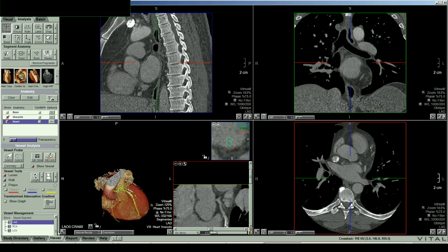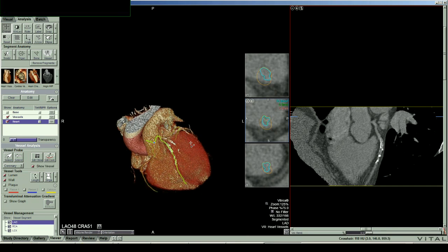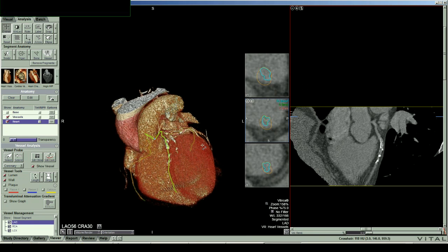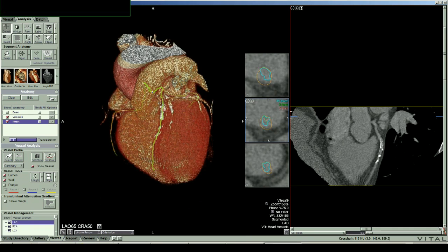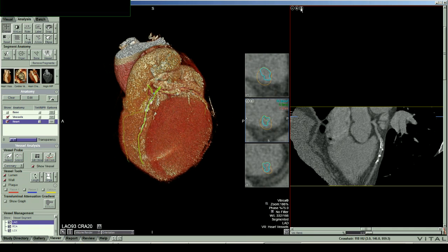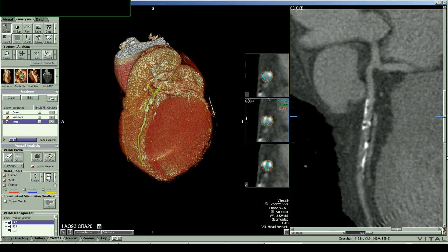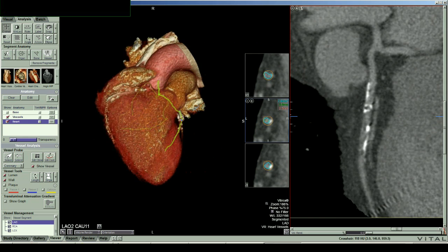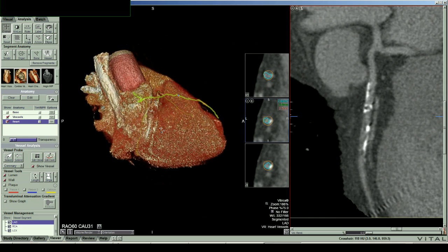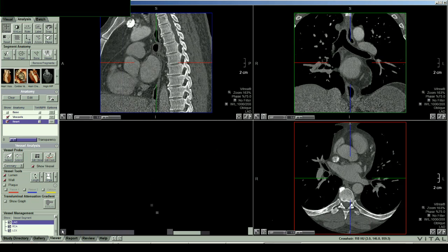So these are the images from Largo, and it's not Largo Medical Center HCA, it's actually Largo Radiology, Rose Radiology. We'll show you these images because they're in such poor quality that you need to know non-diagnostic images when you see them, because it's important to recognize that the image is non-diagnostic, and so the information conveyed is of no value. What we see here is that we don't see a bolus of contrast.